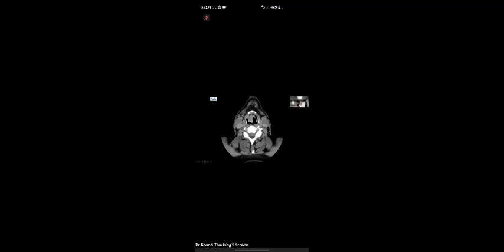What do you think? This is the level of the vestibule. Vestibule? No. Ventricle? No. Okay, this is the hyoid. Yes, this is an abnormal case, so I'm going to go through it and I'm going to ask you questions on this. This is the hyoid bone, pre-epiglottic fat.